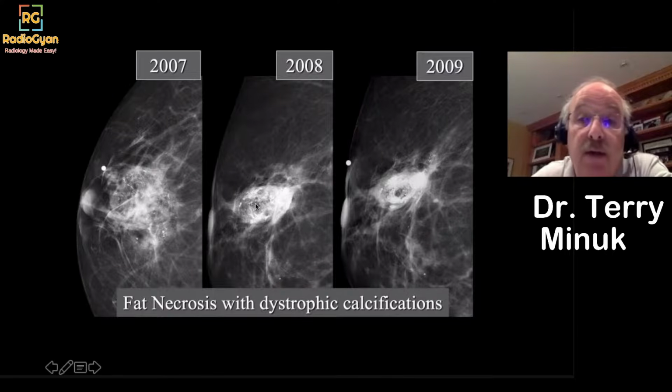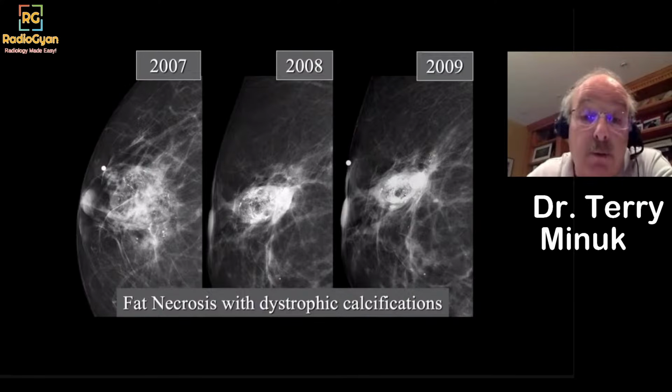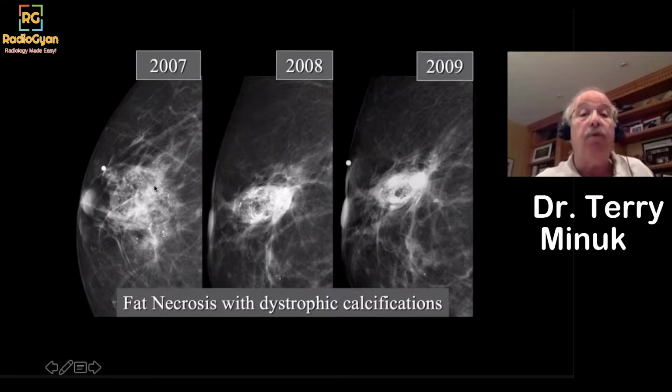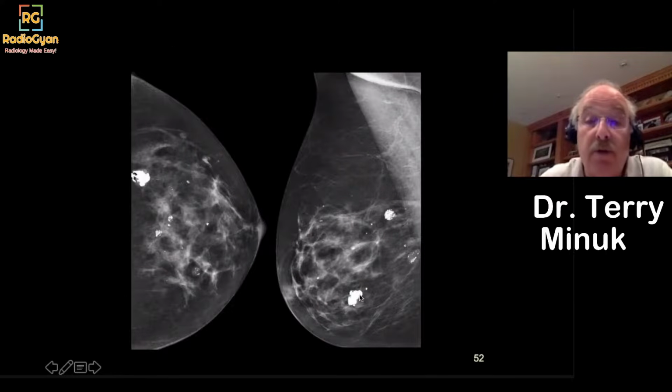Here it is in 2007, 8, 9. The calcifications in the soft tissue, the fat necrosis, gradually becomes more compact, more densely calcified. But you don't want to take a patient like this and do a biopsy of those calcifications. It doesn't improve the fat necrosis. And next year, when she comes back, she'll have more calcifications. They'll look different. You'll biopsy them again. I've seen people who've had their dystrophic calcifications biopsied half a dozen times. And the only reason they're not biopsied a seventh time is because they stopped coming for mammograms. They refuse to come.